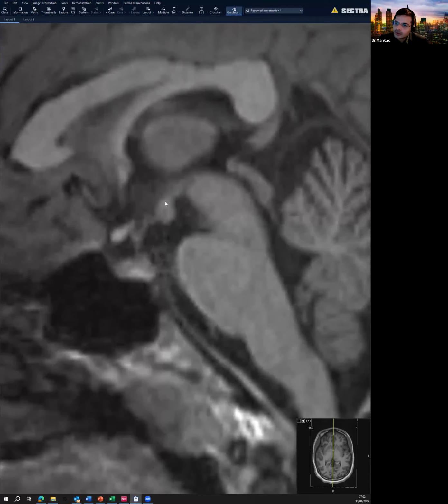Dr. Fahad got that right. And the mammillary body is a part of the hippocampal formation. Sorry, the hypothalamic formation, not hippocampus, hypothalamus. And this is important because you have the thalamic structures, you have the hypothalamus below it.